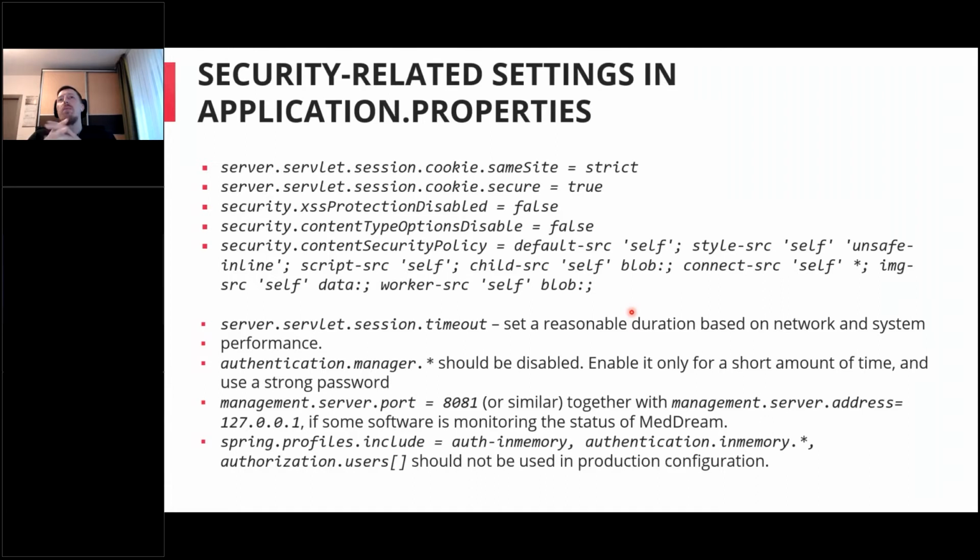Here are some settings related to content security policies, headers, and cookies. I'm not going to explain them one by one, but they can be found in our installation manual. All these settings are taken from that part, and these are security related settings, so you can use them.